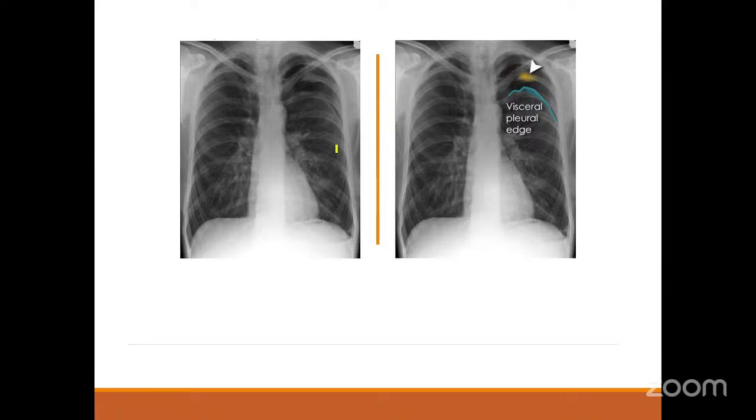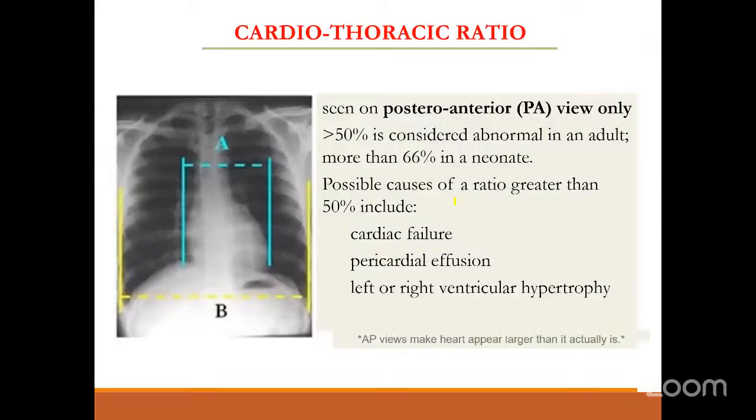You can see here, this is a patient who presented to us with trauma. You can see a rib is fractured, and underlying the rib we are seeing a hyperlucency, a little blacker lung space compared to the lower zone. So this means there is a pneumothorax which has every chance that it can progress. So these are the ones we need to pick up. When you see an X-ray, don't miss looking at the apex and the bones, so we can catch early changes which we can always handle.